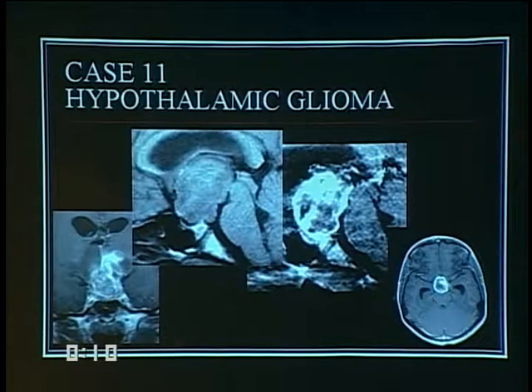Hypothalamic glioma, this is actually coming not from the sella. The sella really is probably normal volume and this big mass sitting above the sella, so this doesn't look so much like a pituitary tumor, although it does look rather like that here. The brain edema here kind of tips you off, and although pituitary macroadenomas can get this large, they generally don't put this much type of edema in the surrounding brain because it takes much longer for them to grow, and they're not growing out of the brain but pushing it up instead.